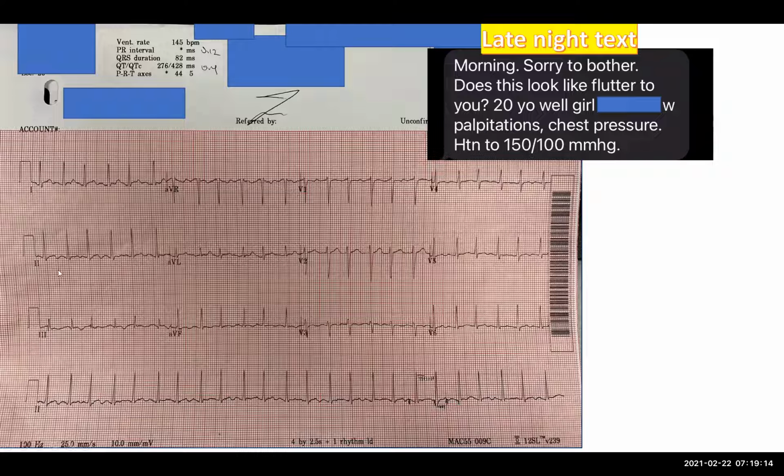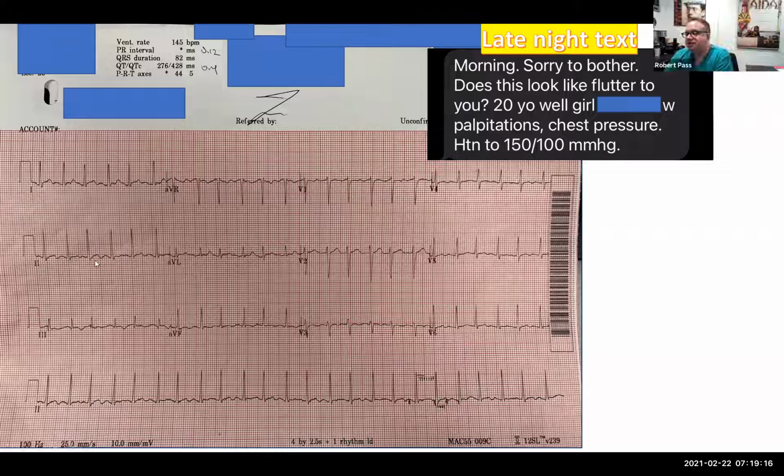And I think that something about the T wave, as you said, sort of gives you an undulating feeling like it might be some kind of atrial flutter here, but it is not. It's just sinus. The key is you want to look and find a lead where you feel more confident that there's an obvious P wave.